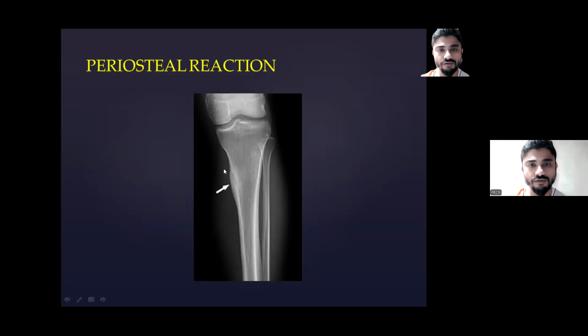in a follow-up radiograph. Okay, if you are not seeing any fracture and your orthopedic colleague is highly suspecting a fracture, then write it in the report that a follow-up x-ray is advised after 7 days, because after 7 days the periosteal reaction will develop, and periosteal reaction is your friend. So the periosteal reaction will help you to identify the exact location of the fracture. So this is the fracture here right now at this point of time. Maybe we can see some faint fracture line over here, but not very confident. But since there is a significant, solid kind of periosteal reaction over here, there might have been a fracture at this level in the past.